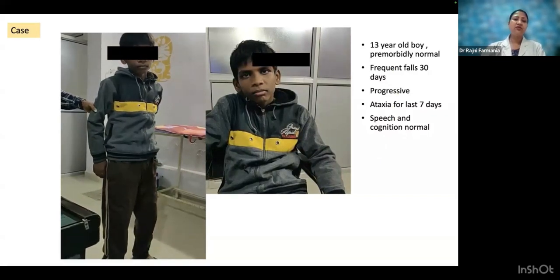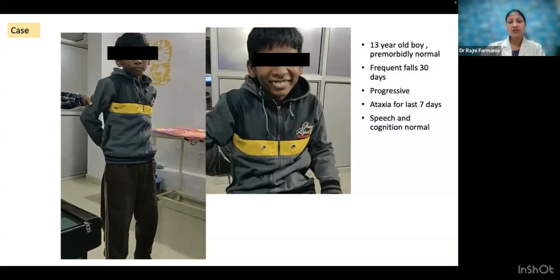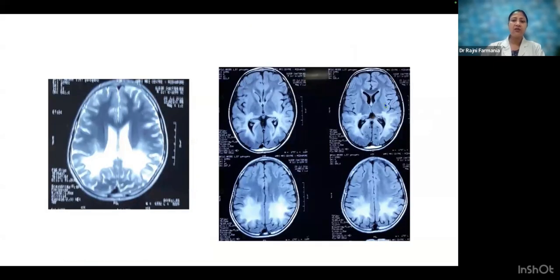So a suspected case of SSPE. Progressive myoclonic epilepsy was a differential diagnosis, and SSPE was suspected. We got an MRI and we got this. So bilateral posterior hyperintensity, and you can see some preservation of subcortical U fibers. In MRI, when we see a diffuse hyperintensity or a leukodystrophy kind of pattern, pattern recognition gives the idea. Is it posterior or anterior, what other fibers are involved, what structures are involved. Here, this was a posterior dominant leukodystrophy, so a very important differential is adrenoleukodystrophy also.